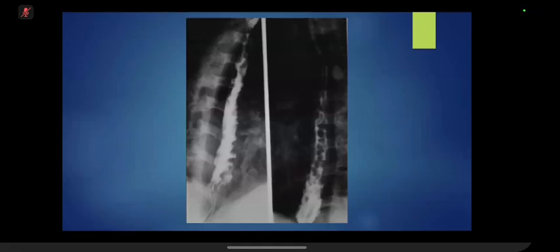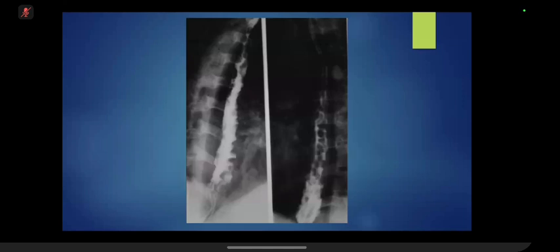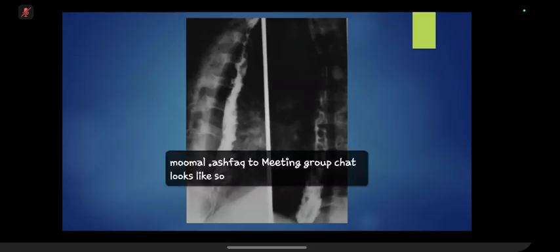In terms of management, you're right that from the previous imaging, if we compared, we can see that they are increasing. Okay, so they are definitely increasing. So the patient must need some kind of management for that. But you're sitting in your office and you're watching this barium study, and the patient is 56-year-old and is complaining of dysphagia. So the first thing which should be in your mind is that you need to exclude malignancy. Okay. So in this case, as these were varices, what is the differential of varices?